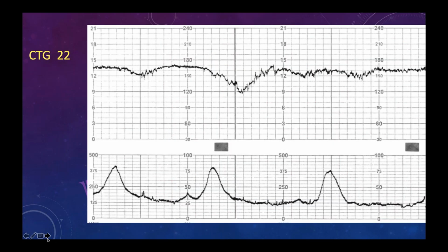Who wants to do next? Ma'am, I want to do. Okay, Madhu. This is the 10 minutes I want to see. But the 2 contractions are there, and baseline is about 160, ma'am. Am I okay? Yeah, continue. It is 160.